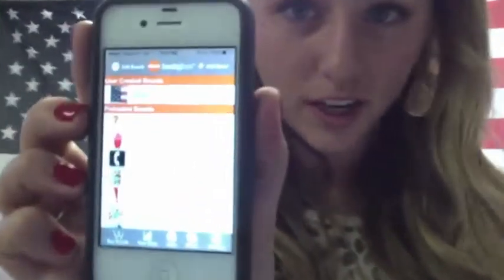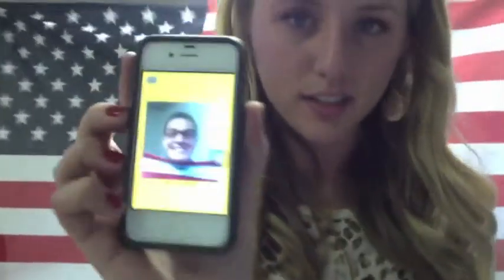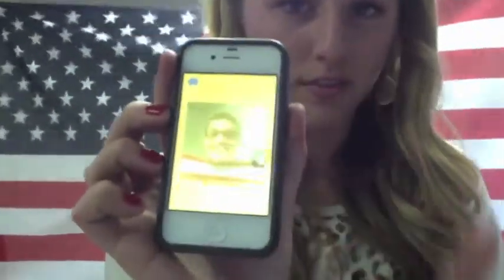As you can see, Ben is the only one on that certain board, our flags board. At the top it says boards you have created. You'll click flags, and then guess what I can do? Ben is my friend. You can do that with things that the child loves that aren't available on the actual board. You can do that with friends, with family. You can say, I love grandma, or I like cereal. Things like that make it personal and actually make it so the student has a voice.